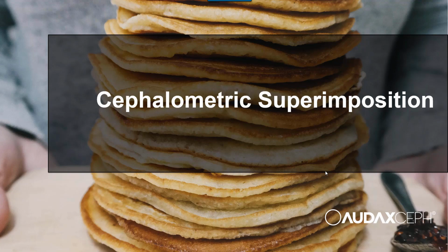Okay, we are live. Hello everyone and welcome to today's webinar about cephalometric superimposition. We will not talk about pancakes on top of each other, but rather about overlaying several analyses of the same patient on top of each other.